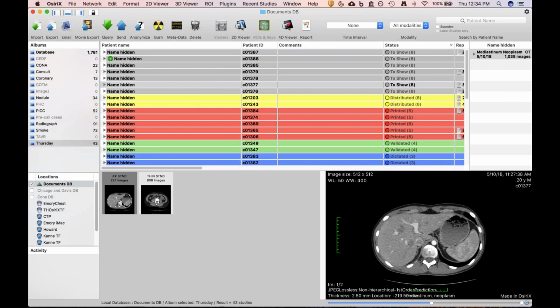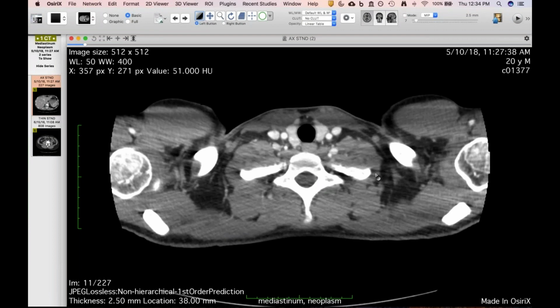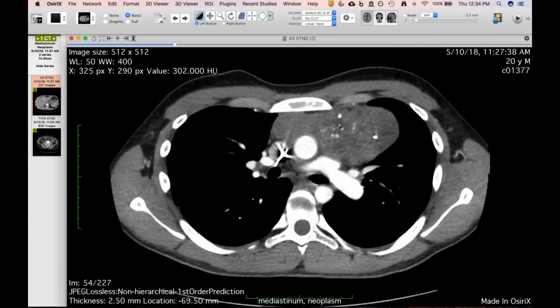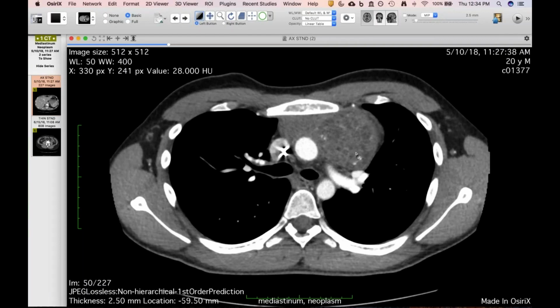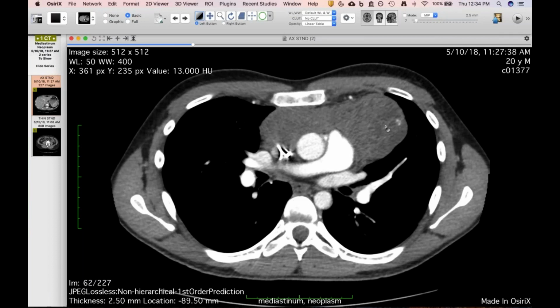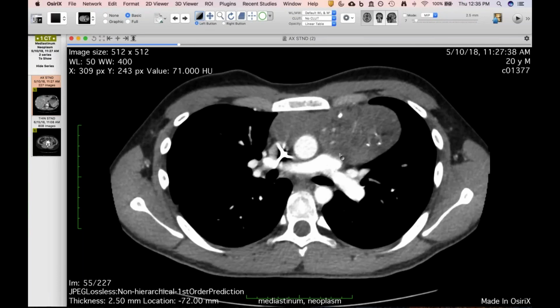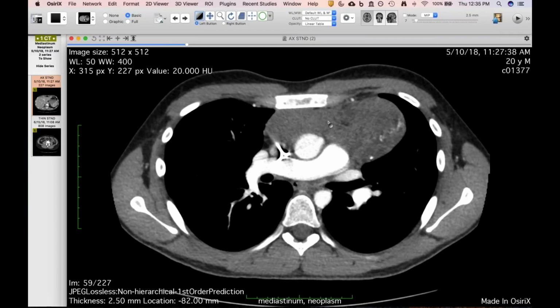And this is kind of an interesting case. So this is, as you can see, a 20-year-old, and I don't have a radiograph, but I'll show you the CT. He presented, and he has a large anterior mediastinal mass. And this one is a little alarming because if you see just the left-sided portion, you see that there's areas of macroscopic fat here, some calcium or bone or rudimentary teeth or whatever. So it sure looks as if it's a mature teratoma.